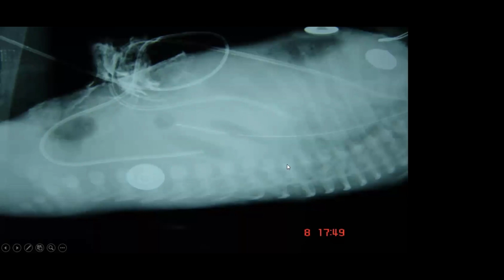Okay, here just try to see what I was talking about, that the middle of the vertebral body may not be ossified, so you might see a little bit of a cleft. Okay, so start identifying those.